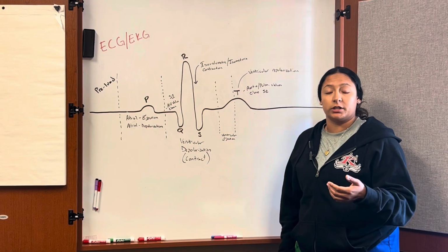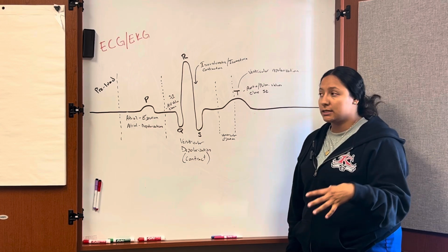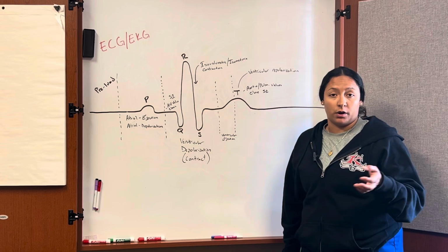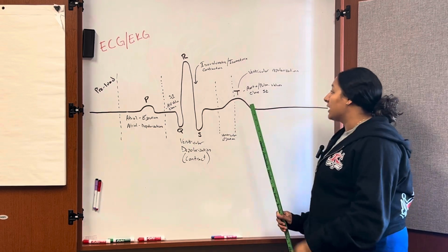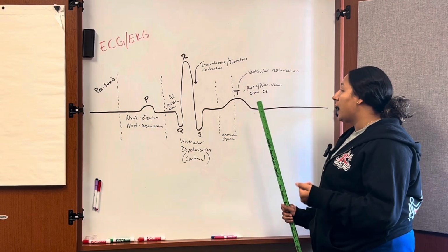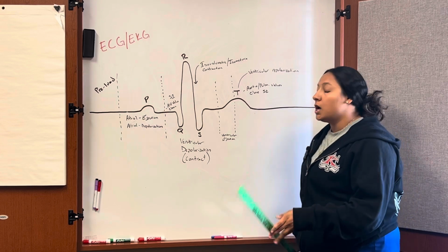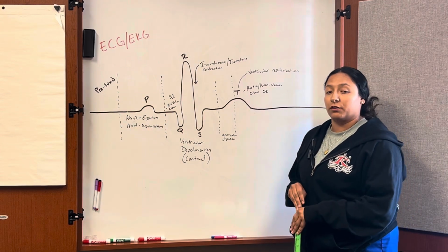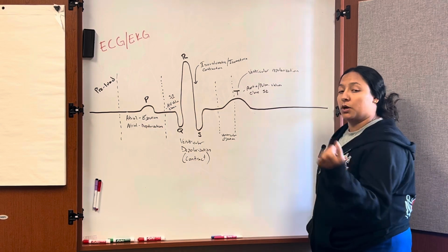So when I say repolarization, that's when we get a recharge, or they are relaxed to prepare for that preload again, to start the process over. At this point as well, we get our S2 sound, the second sound that we hear, and that's our aortic and pulmonary valves closing, once again to not allow for that backflow into those other chambers. And then we start the process all over again.